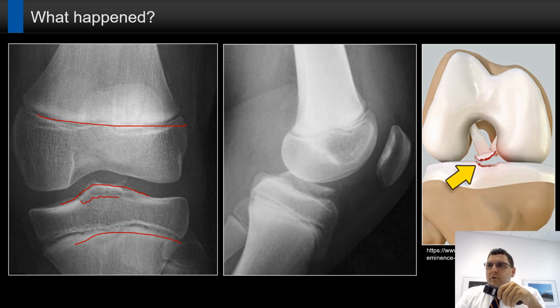If they have a knee trauma, the ACL is not usually torn in between, but they can have a bony avulsion from the tibia plateau, basically. You need to know these facts so that you don't miss this, because this can also be very subtle here. So always look for this area if you have an adolescent with a knee trauma.